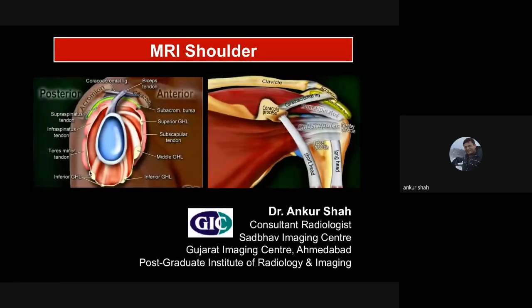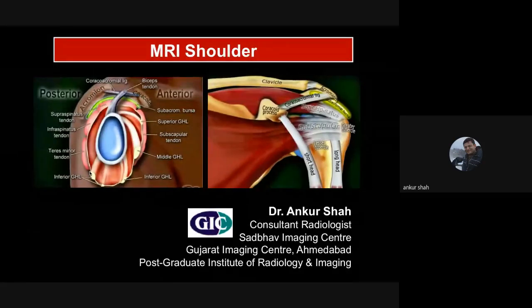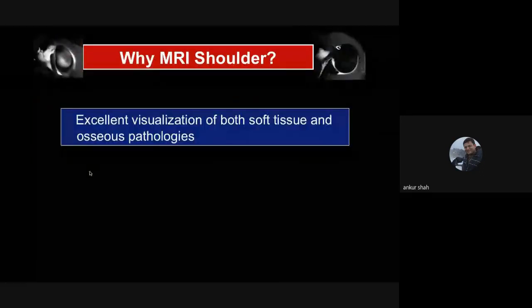So after the spine and knee imaging, we are coming to the MRI of shoulder joint. Just like knee, again, shoulder is a joint which is very frequently imaged. Many patients present with shoulder pain, and they will come to you maybe even more frequently than knee pain. It is good to have some knowledge of MRI, of how the different structures look on MRI, how different abnormalities look, and what the standard format of reporting is for these abnormalities. It will become easier for your practice.